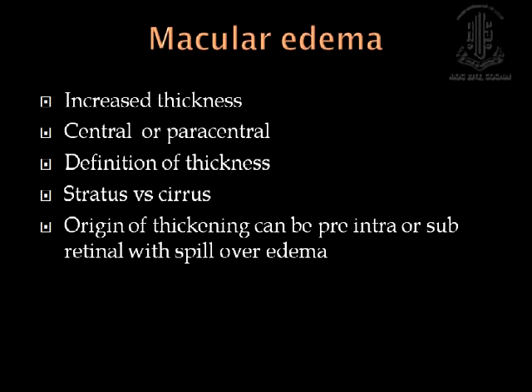Macular edema means increased thickness of the retina. This increased thickness of the retina can either be central or paracentral. So what is the definition of thickness and how do we grade thickness? Thickness will be different in the Stratus versus the Cirrus OCT.